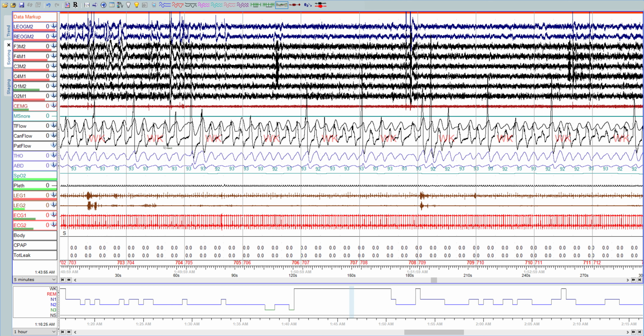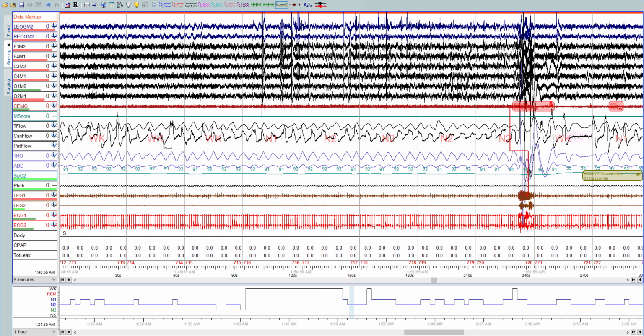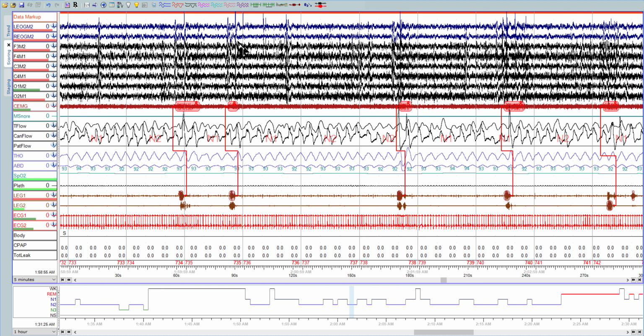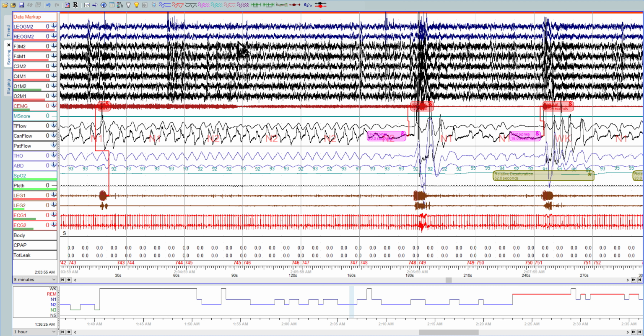Just waiting for those periods of REM where you marked all the apnea. Okay, here we go. I agree there.